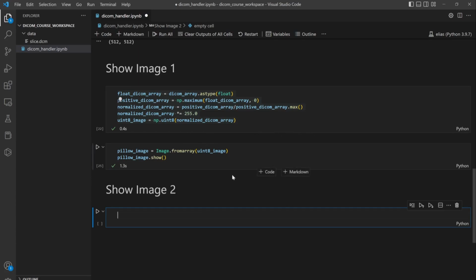You will see that it looks similar to what we did, but the tricky thing is that this will make it easier to change the contrast of the image if you want. So let me show you how to do this and where we can change the contrast of the images using the same variables that we'll use now.